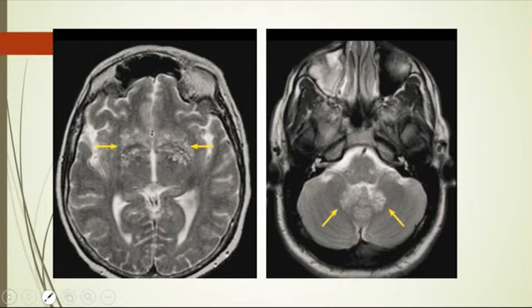It's like prominent Virchow-Robin spaces, dilated perivascular spaces, but it is not dilated due to the usual aging or atrophy. It's dilated due to cysts within the perivascular spaces, the cryptococcosis cysts surrounding the vessels, dilating the spaces. Okay, this is a common board case. It happens a lot.